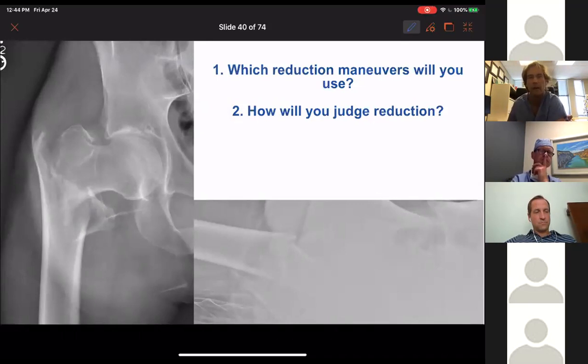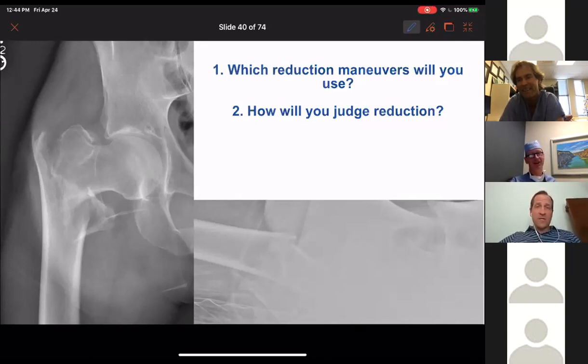All right. Before we go any further, I'm going to push you guys a little bit further. How do you know when internal rotation isn't the correct answer? So hard. There's such a lack of radiographic clues. The shaft is almost always externally rotated just because of how you look at it on fluoro, but how much it needs, when it's reduced rotationally based on the fragment appearance, it's hard. Sean, Tom, anything? Paul? Yeah, welcome to my cluster.